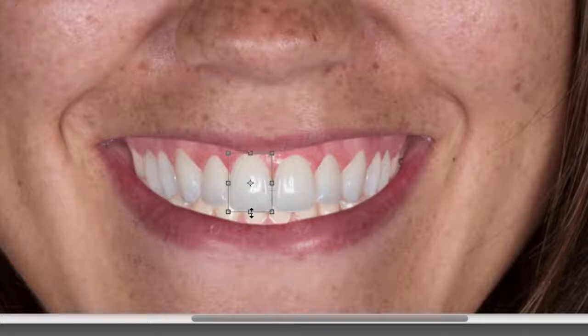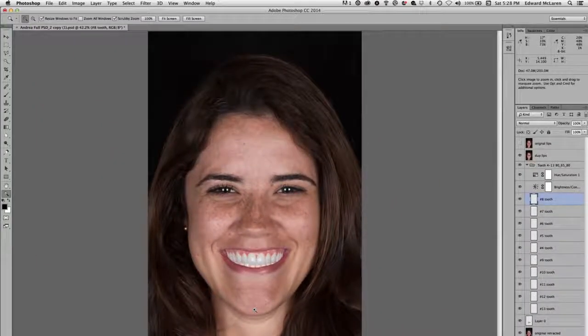So now what I found about doing this, I used to use other programs, presentation programs, and draw lines years and years ago, and those are good things to do. But if you know a little bit about Photoshop, you can see how we can custom tweak lots of little things here very quickly, so that hopefully we can get the patient to agree to something and go to the next level.